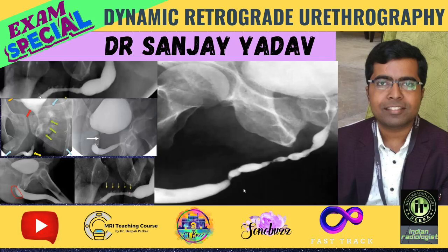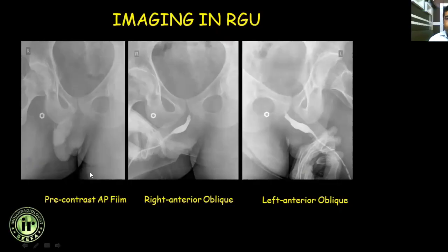So again, to make you understand, before you do the procedure, the pre-contrast supine radiograph shows there is no evidence of any radiopaque shadows. And then they have taken the first image, the right anterior oblique. There is smooth passage of the contrast through the anterior urethra as well as the bulbar urethra. Then you have one more, the left anterior oblique.